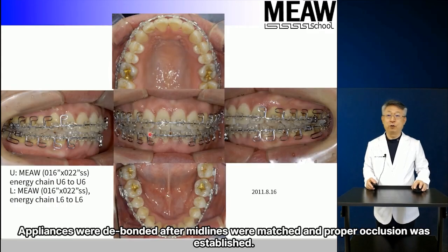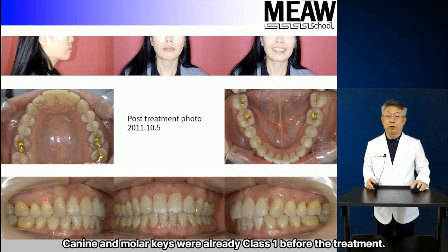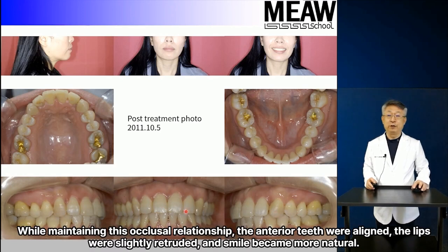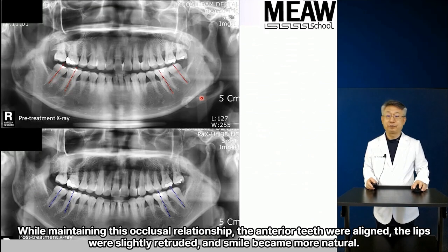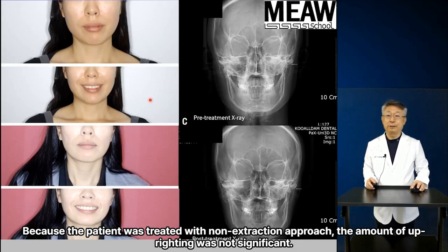Appliances were debonded after midlines were matched and proper occlusion was established. Canine and molar keys were already class 1 before the treatment. While maintaining this occlusal relationship, the anterior teeth were aligned, the lips were slightly retruded, and smile became more natural. Because the patient was treated with non-extraction approach, the amount of uprighting was not significant.